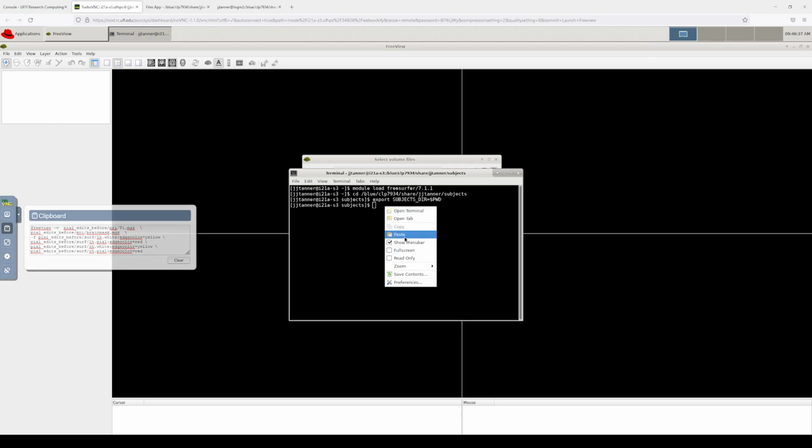And so it's doing a right click, a middle click can work as well. For some imaging, I actually recommend you have a mouse with a middle button, like a scroll wheel, a middle mouse button can help with some of this. But then you should be able to paste it in there. I won't do that because I'm just going to load this the long way. If I wanted to show copy and pasting from your computer to HiPerGator, you have to go through this clipboard.